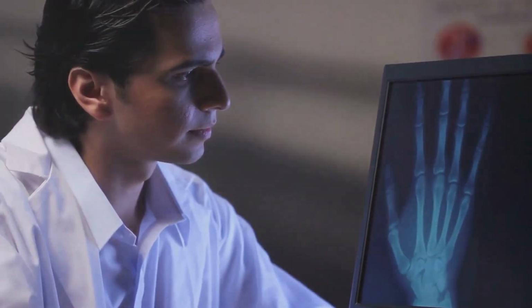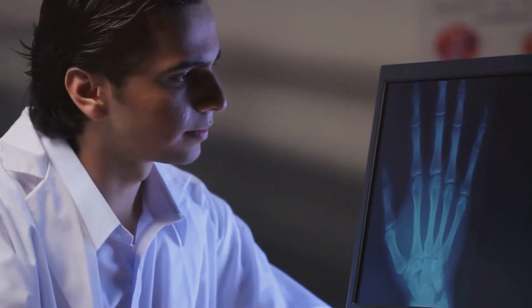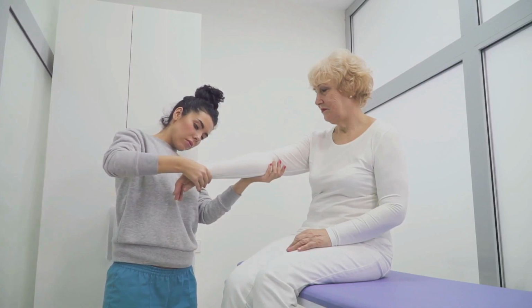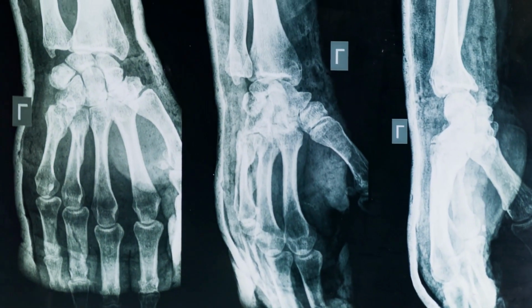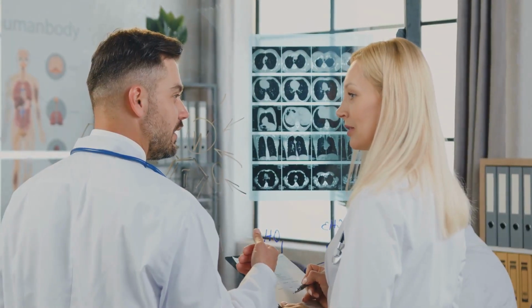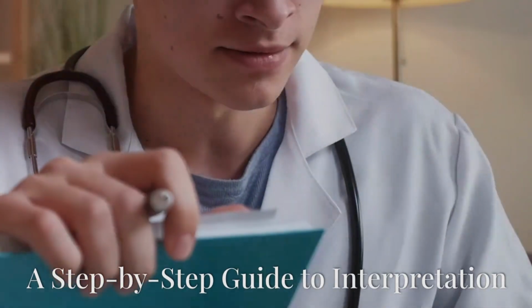The lateral view is excellent for assessing alignment. We can see if any bones are shifted out of place. It also gives us a good look at the carpal tunnel, a narrow passageway in the wrist where the median nerve travels. The oblique view is particularly helpful for visualizing the scaphoid bone, which is commonly fractured. By comparing these 3 views, we can build a 3-dimensional understanding of the wrist structure and identify any abnormalities.